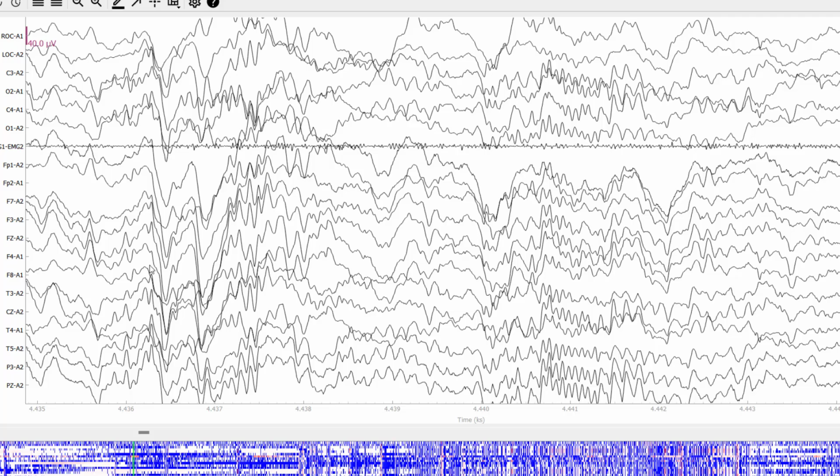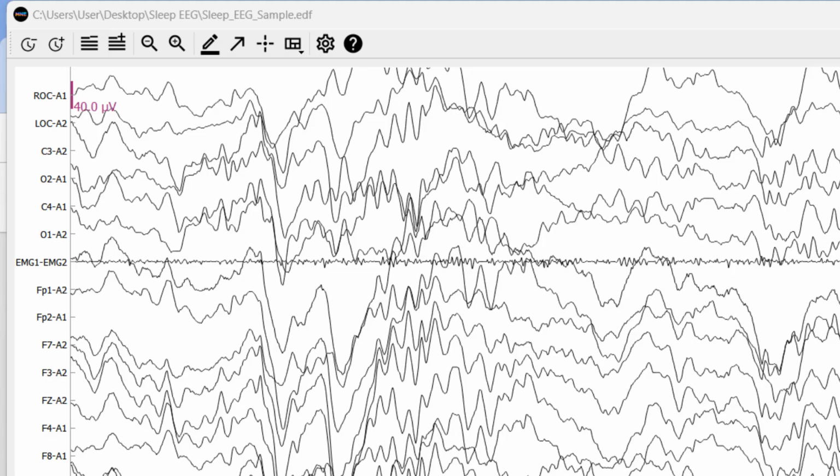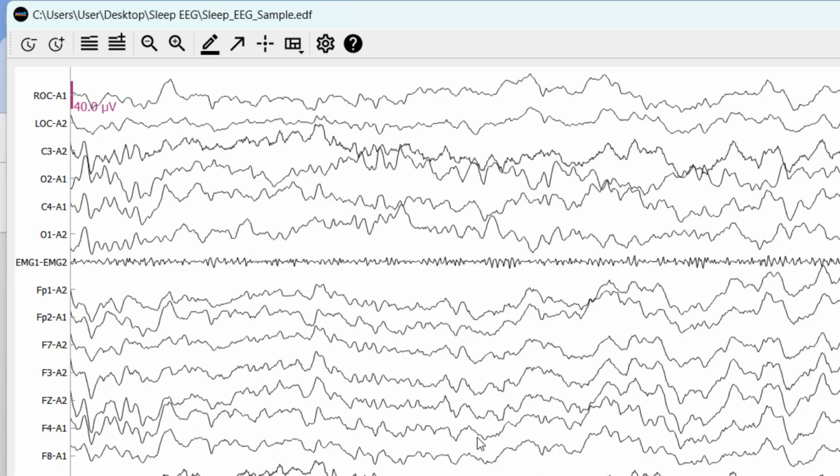So my friends, a red area means the Z-score is high, and it means that the signal is far from its average. So these red sections of the EEG indicate artifacts, for example, muscle bursts, electrode pops, strong eye movements, or other abnormal fluctuations.